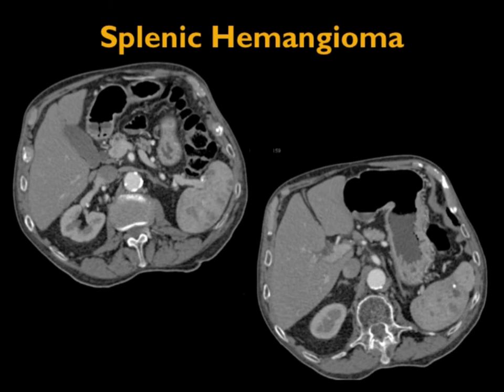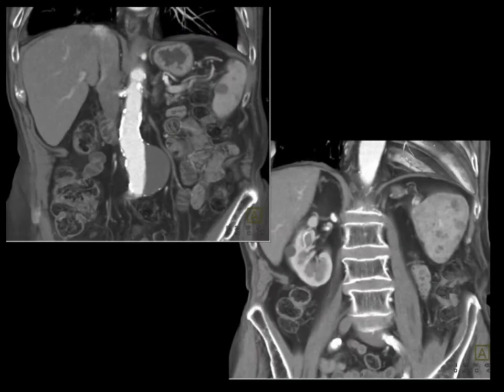Another example here, spleen, mottled enhancement early, cystic lesions, calcifications. When you look hard, there are multiple cystic lesions present. Again, multiple cystic lesions is very good for hemangioma. These aren't simple cysts. If this patient was febrile and these weren't here before, I'd be thinking about abscess.